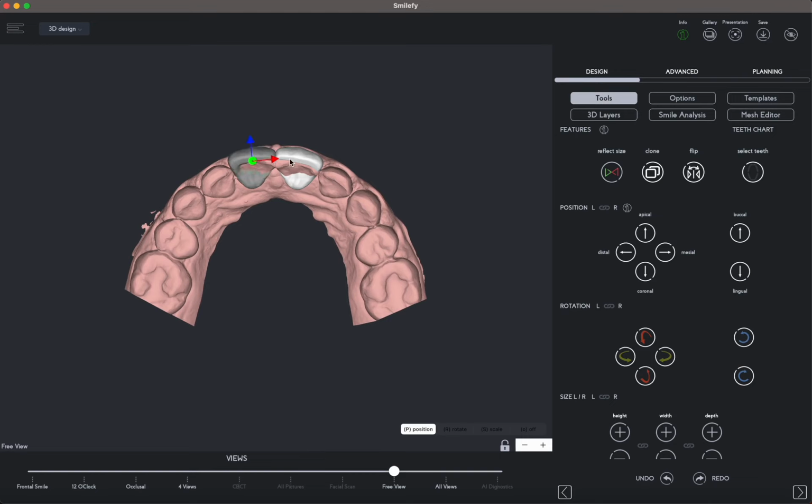The mockup is additive. Now we need an ideal design, the design over the prep file, like this.